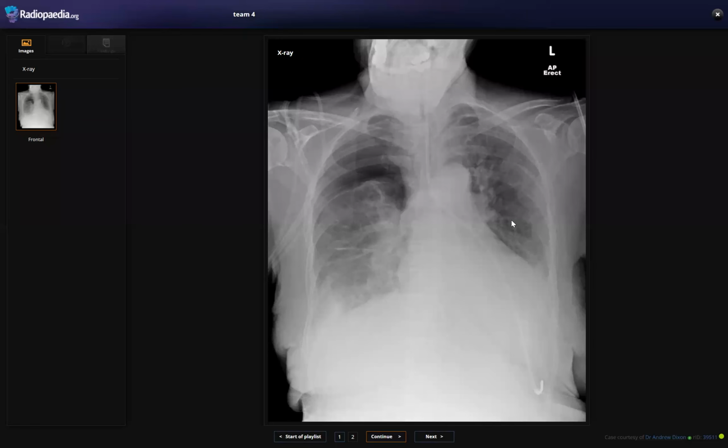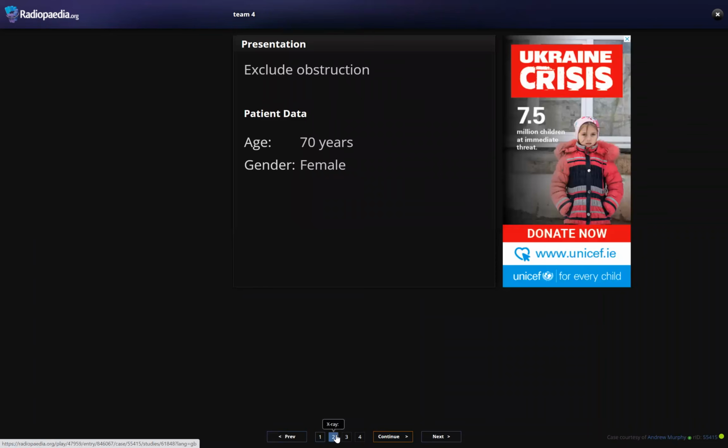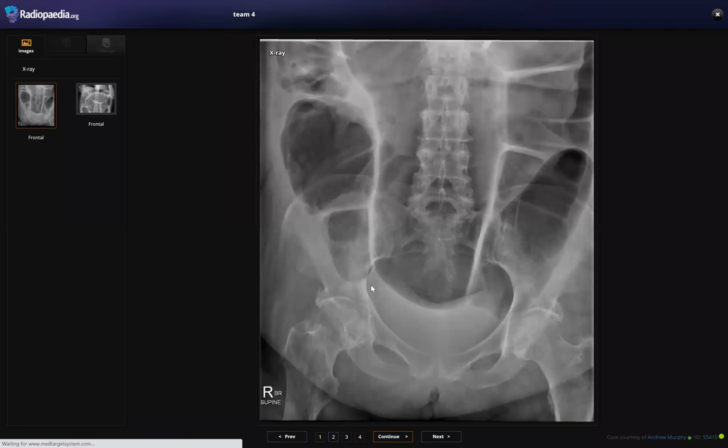I can't see any evidence of fractures, but still, if there is history of trauma, I need to review with CT for more assessment. But also, this malplacement of the nasogastric tube can be caused due to esophageal rupture. Perforation.